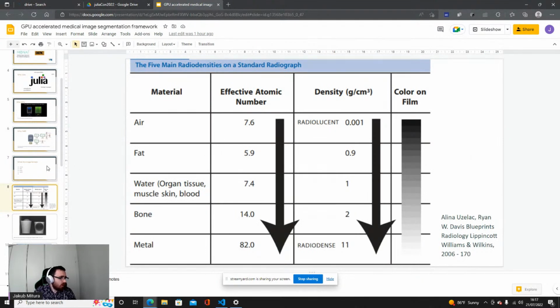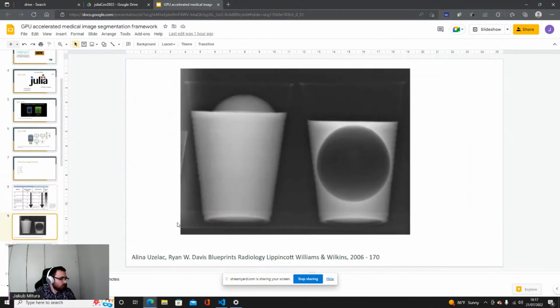Now, when we are looking, for example, at this image, this is the classical radiological image. What we can see here are the physical properties of the bodies that are here. Whether this is a balloon, like here, filled with water, or an empty one, we can see whether the X-rays can get through or not. This is quite simple. When you shine the X-rays on it, you can just describe whether they can go through or not, and this is just the map that shows it.